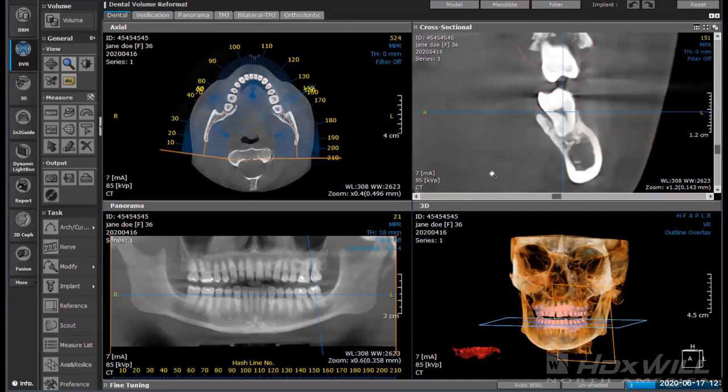And then you can also do the impression. With the impression, though, the software is going to need to invert that impression to create a positive out of a negative, so you're adding levels of possible error. So again, the intraoral scanner would be first, the stone model scan from a CBCT would be second, and the impression scan would be third as far as predictable accuracy.